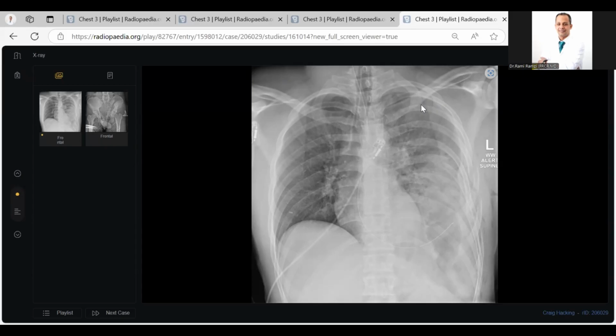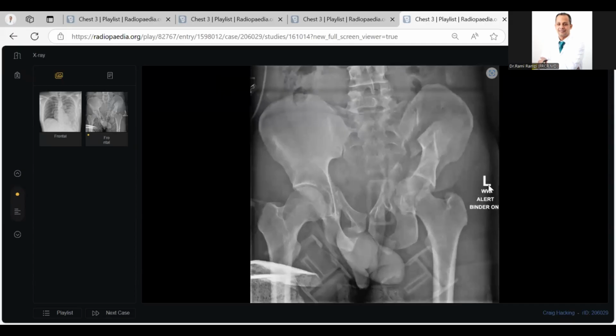If I told you this is a polytrauma patient, what else should you look at in the post-contrast CT, other than this fracture and this diaphragm? Vascular, I mean, if there is any active bleeder, that is the most important thing to know. The thoracic and abdominal aorta and all the major visceral vessels should be evaluated immediately.